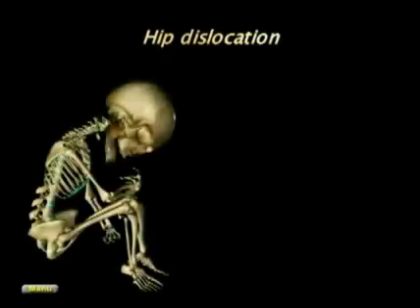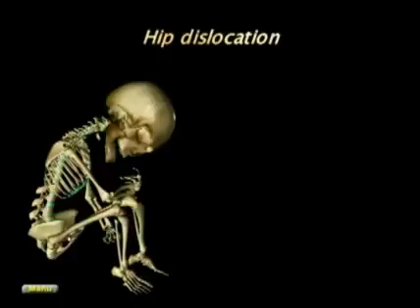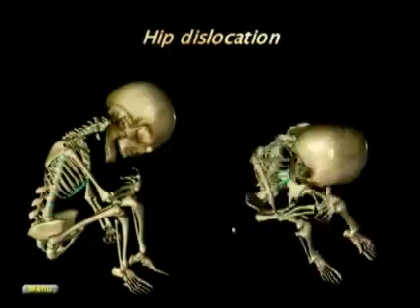A hip dislocation is another thing we can see when we look at the limbs, and the hip dislocations prenatally are always posterior hip dislocations. I don't want to say that this is a good screening tool. The postnatal screening is a lot better than the prenatal screening, but from time to time you may look at hip dislocation also.